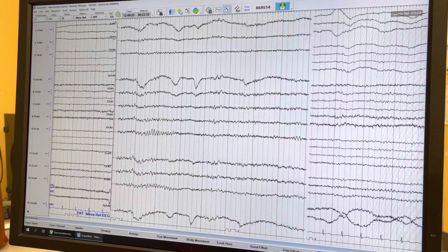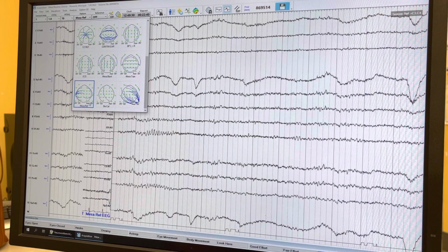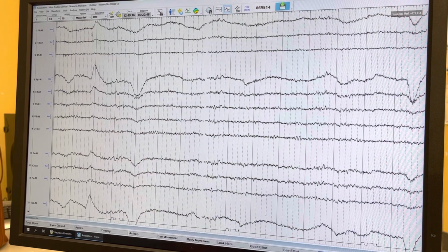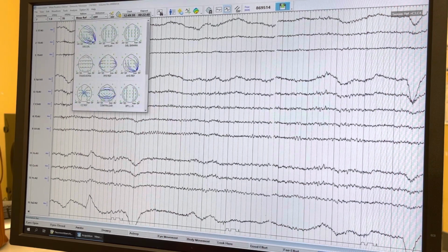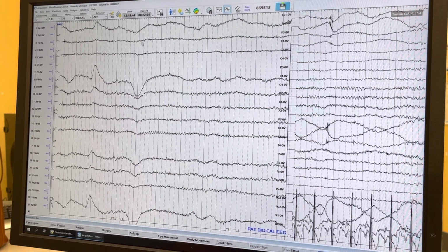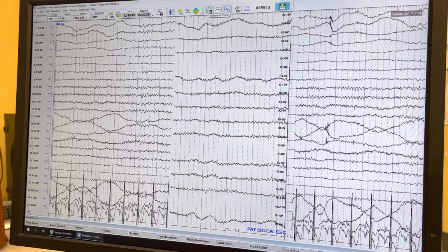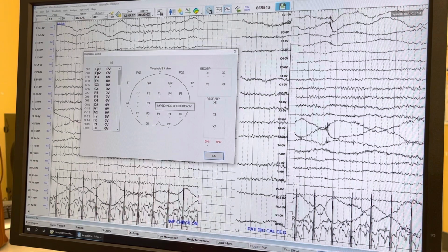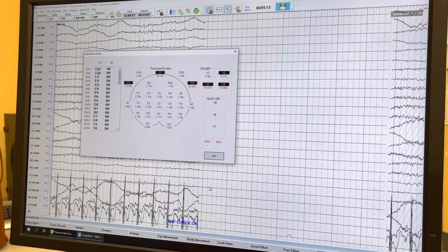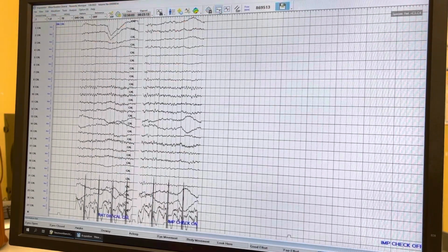Oh, that's funny. Looks like we didn't finish that one up or something. Well, I'll have to work on that one. But anyway, and then go back to Digical, and we can do our impedance. You have to hold it down for 3 seconds before it turns on. Then you hit OK, and then we can do our calibration right there.